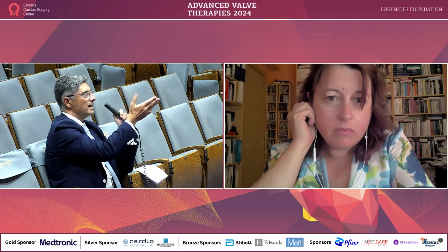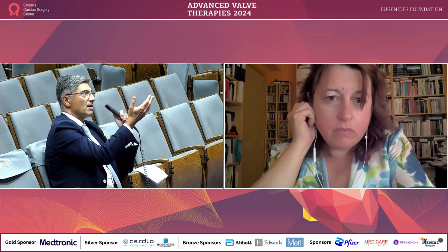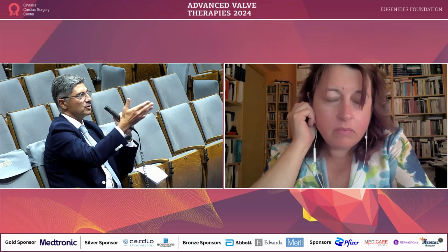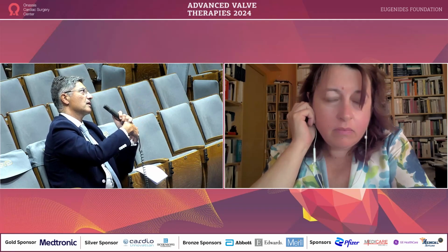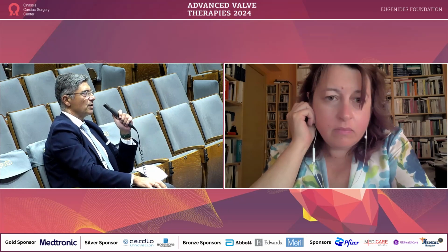One failed ring in the aortic valve, where we did TAVI, and another failed ring in the mitral position, a semiform ring, 32, with paravalvular leak, which was not evident in the 3D printing based on the CT, but we had to rely on the TOE images that showed clearly that it's a paravalvular leak, on top of the central leak that is due to the rupture of the neochordae.